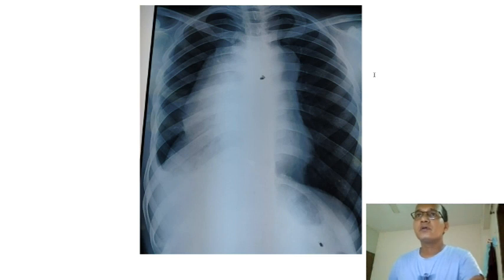Today in this video we will learn two very important X-ray tests. This is the first one.